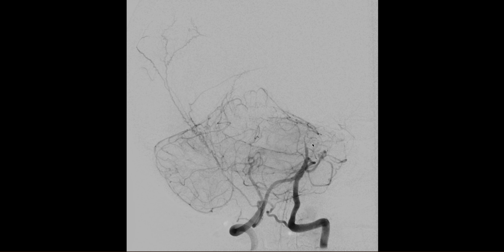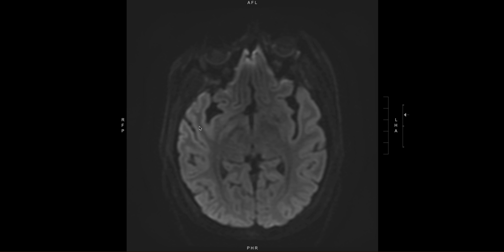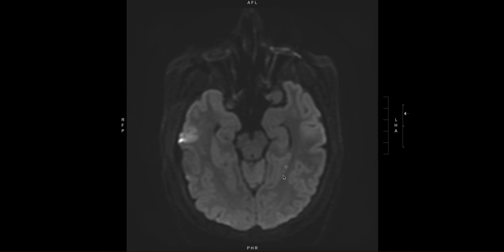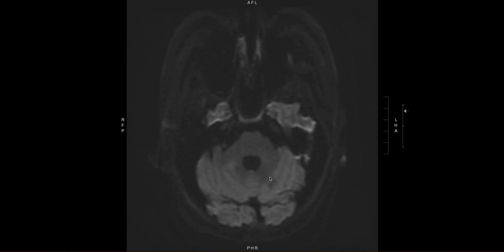So unfortunately, there wasn't a good treatment option given the time frame and the underlying vasculopathy for this patient, but going to neuro-IR is definitely the right call to see if there's anything that can be done safely to help the patient out. And then I'll just show you the final MRI that was done for this patient, just looking at the diffusion. Now we have new infarcts here in the left occipital lobe and the posterior circulation, and there's evolution of that prior cerebellar infarct.